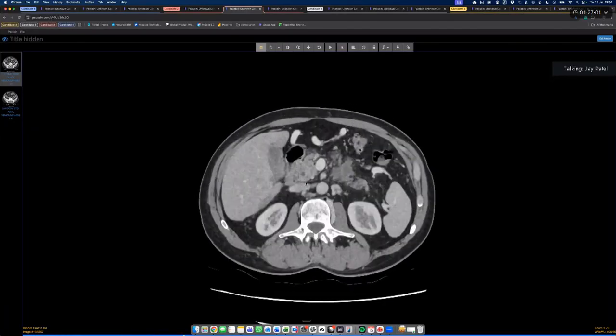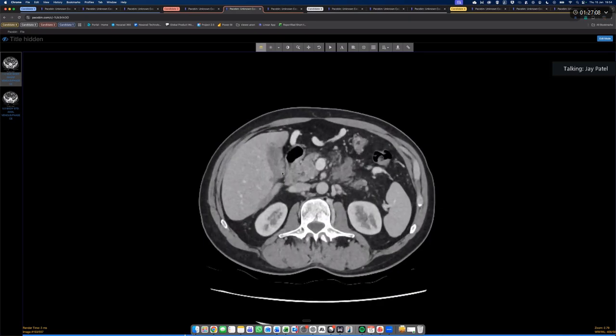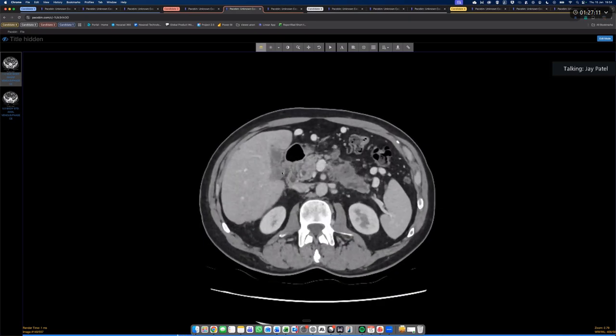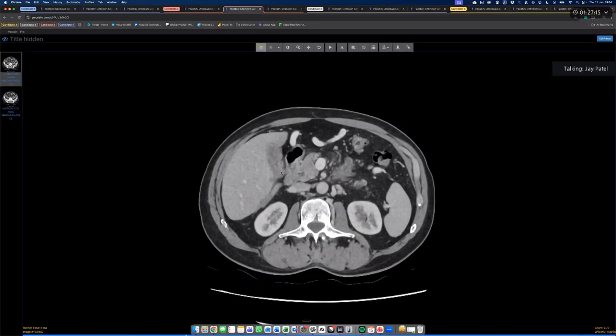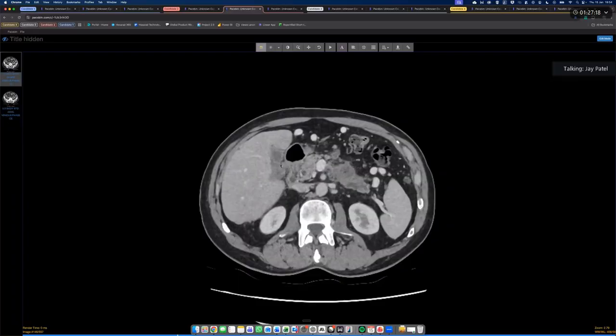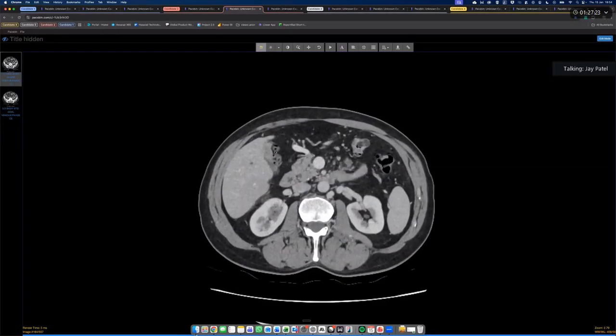Wouldn't call it normal, but it's not my main focus. I would probably think this is chronic cholecystitis. Chronic cholecystitis can look a bit, the gallbladder wall can look a bit fluffy, can look a bit irregular, but if you go down, there isn't really any pericholecystic inflammatory change. Look at the fat adjacent to that gallbladder, it's pristine. You don't get pericholecystic inflammatory change adjacent to some of the gallbladder and not the rest. Makes no sense pathologically, right?